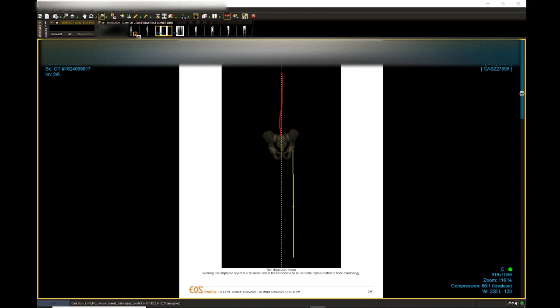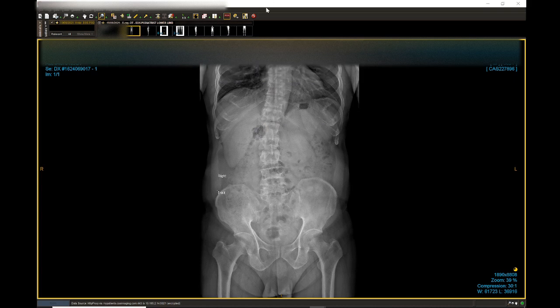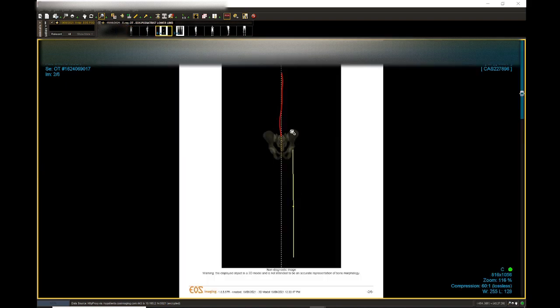Right, it actually appears a lot worse on the normal scan. All right, but you can see what's happening with the back here, coming in one direction. So he's got, again, there could be a muscular imbalance, because an 8 millimeter difference won't cause that much curvature of the actual back. So there must be a functional part, or a muscular imbalance, tightness, whatever, causing this amount of scoliosis. Right? So that's from the front.